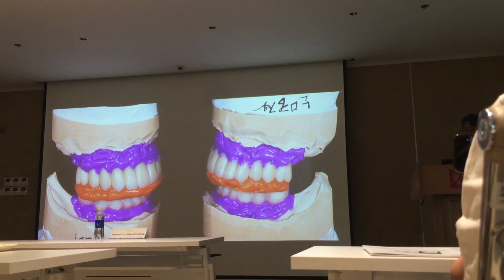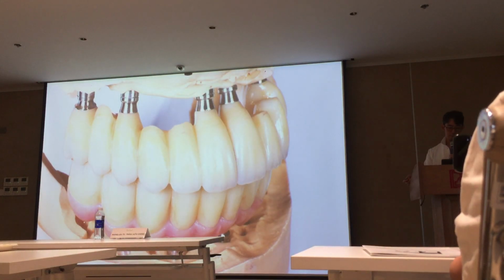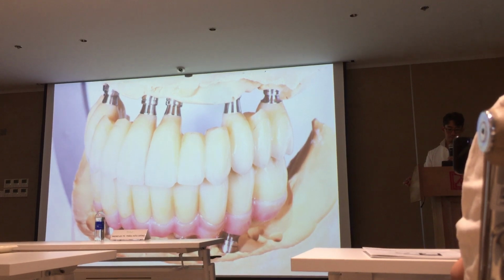And my zirconia technician did a great job, and he finished this piece like this, and returned the final prosthesis to me like this.